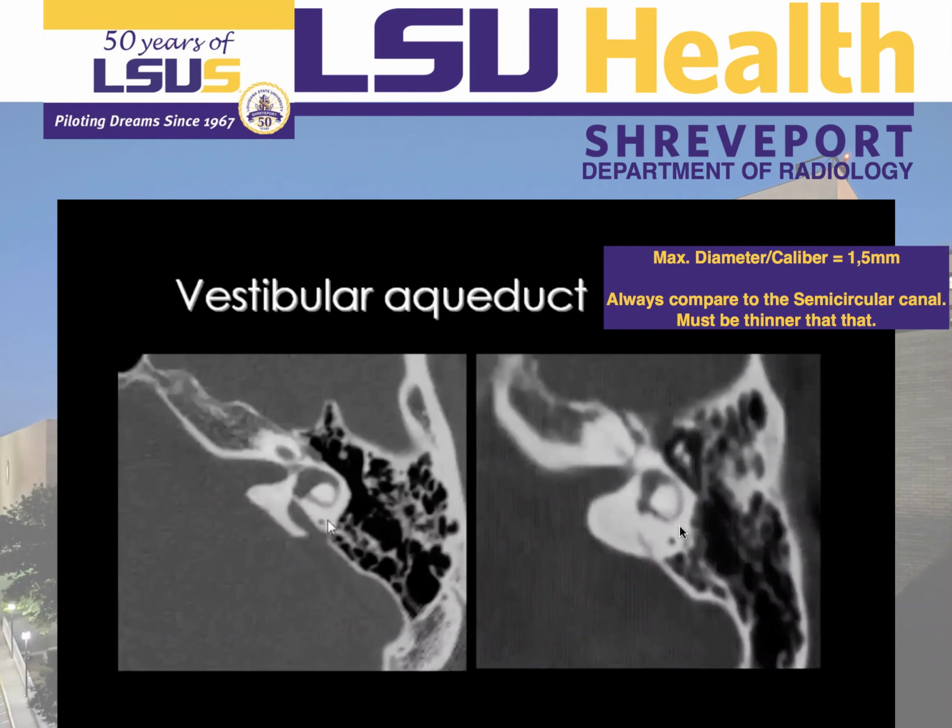Just saying here, the maximum diameter of the vestibular aqueduct should be 1.5 millimeters, okay? But we don't usually measure that. We always compare to the posterior semicircular canal.